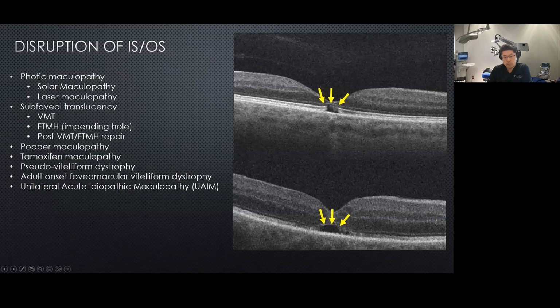However, if you really scrutinize the OCT images of patients, you will see the subtle differences between the inflammatory defects and defects caused by detachment of the vitreomacular junction. The inflammatory process usually has a little bit of fluff to it, much like your freshly diagnosed laser pointer-induced maculopathy.